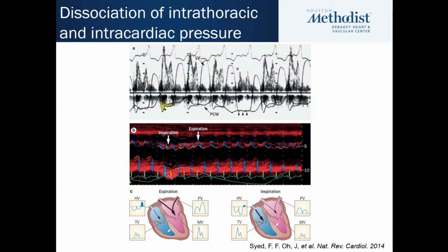And then this is what we see in the mitral valve inflows and the tricuspid valve inflows. A similar phenomenon occurs in constriction, but with minor changes. But what I want you to review here is what happens to the mitral valve and the tricuspid valve Doppler.